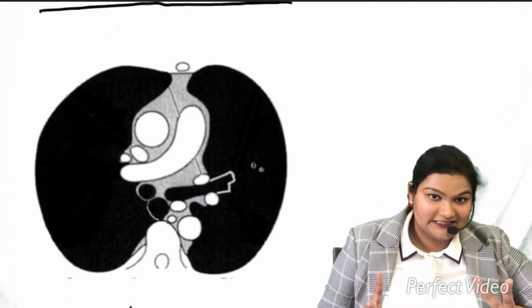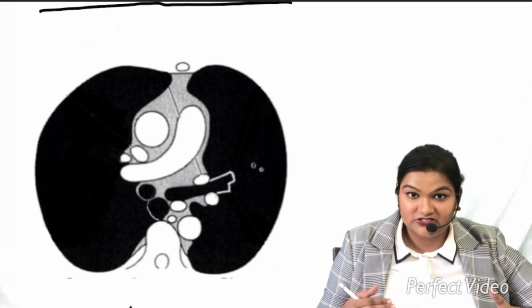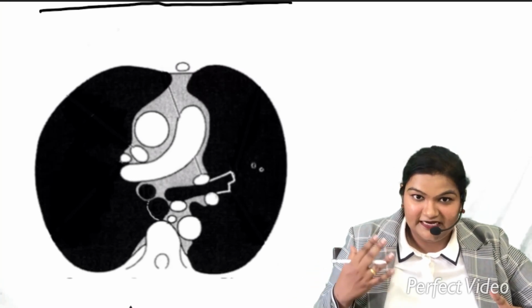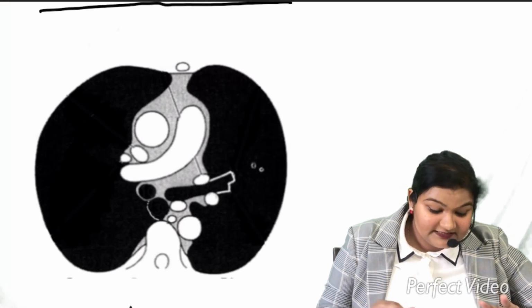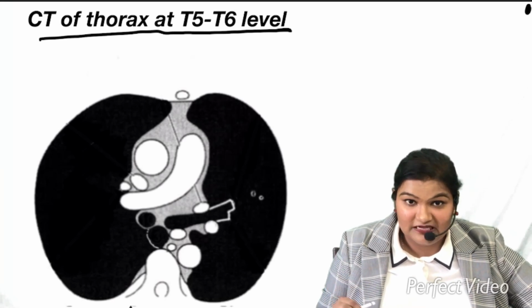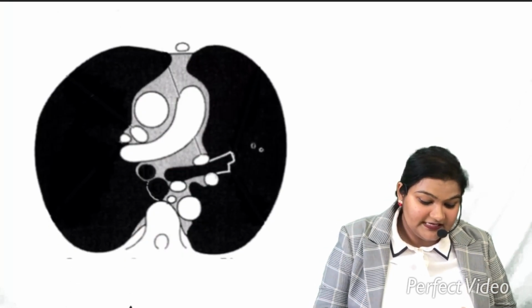Two disclaimers in this lecture. The first one is that as we are moving downwards, the structures are getting more complicated, because as time passes or as the distance passes, it gets more difficult and complicated. And second, whatever levels I am mentioning are the probable levels, not specific levels. So please consider that. Now let us move towards the scan.